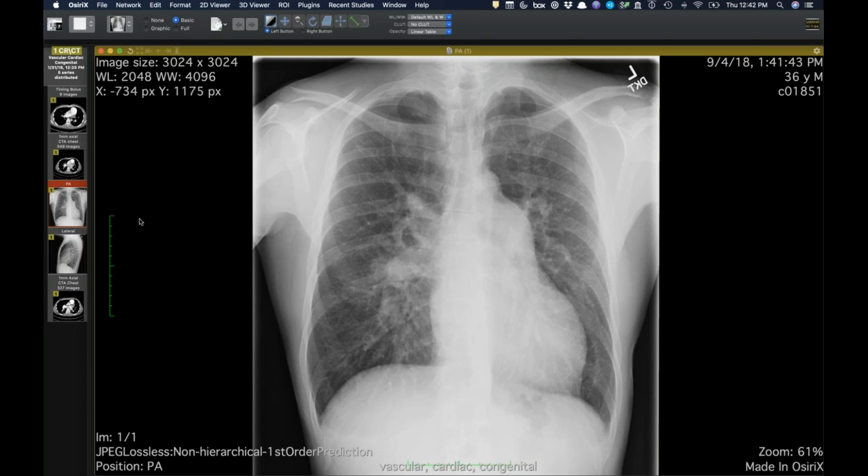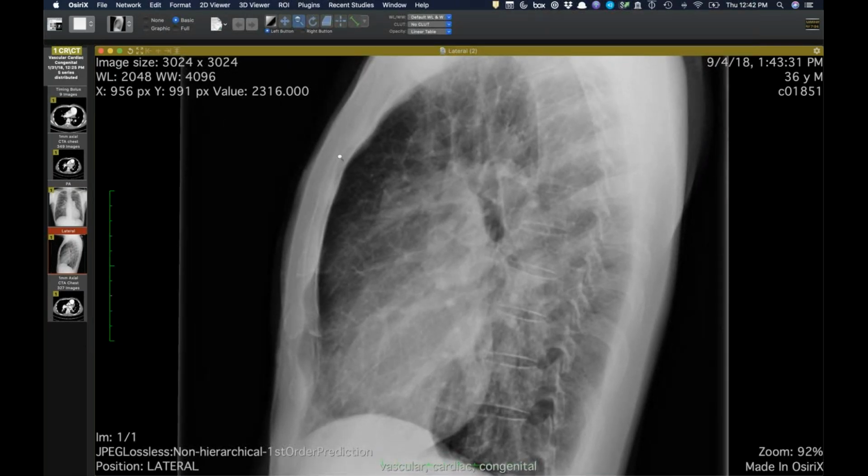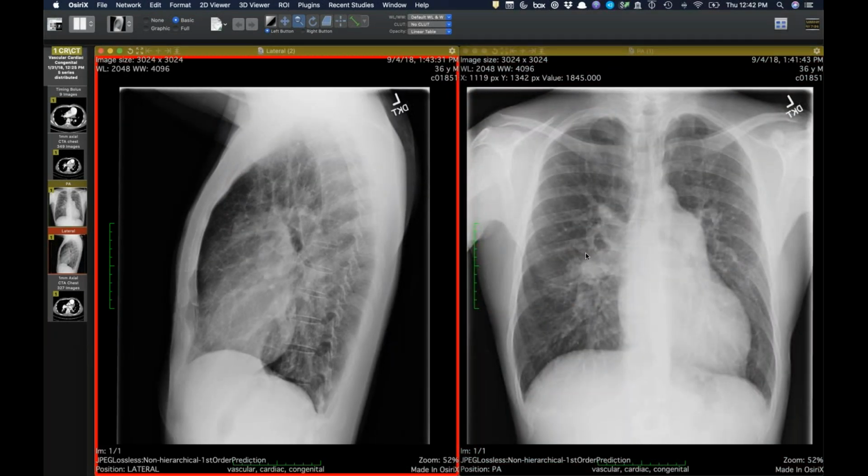And I actually wish I had a radiograph to contrast it with this case. This is a 36-year-old who immigrated to the United States when they were young, and has not been seen in the healthcare system until recently. This is the best radiograph I could find from a couple years ago, and you can see on PA and lateral, big hila, big left pulmonary artery, and of course this is not lymphadenopathy. These are all vessels. There's nothing in the subcarinal space. This is a huge right hilar vascular opacity, huge left pulmonary artery. The right ventricle looks pretty large, left ventricle maybe as well.